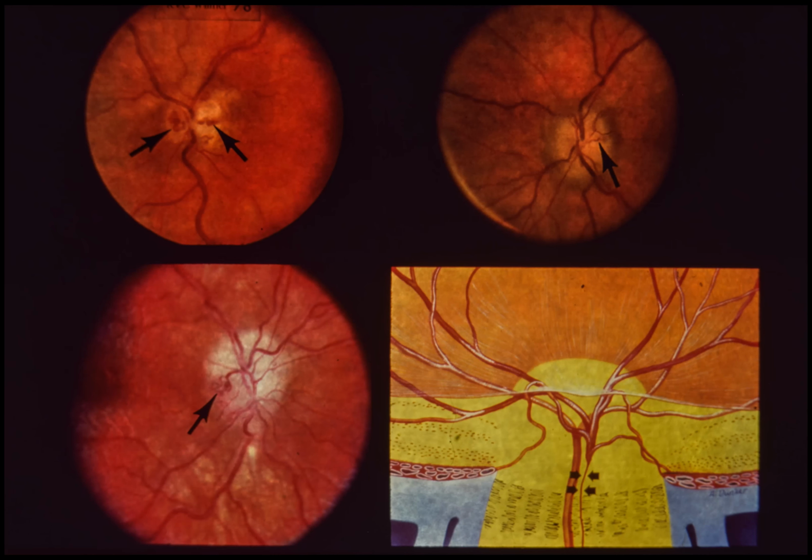Slide 78. Optic atrophy and optociliary shunt vessels. In most cases of optic atrophy, it is the patient's history rather than the optic disc appearance that helps determine the etiology. The triad of blindness, optic atrophy, and optociliary shunt vessels, however, has been identified as an indicator of chronic compression of the intraorbital or intracanalicular optic nerve.